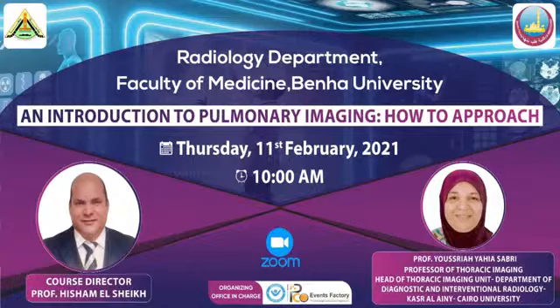اوكي نبص حضراتكم مع بعض كده على الشاشه ان شاء الله. اوكي let us go to the pleural. نبص على الاسبستوس.